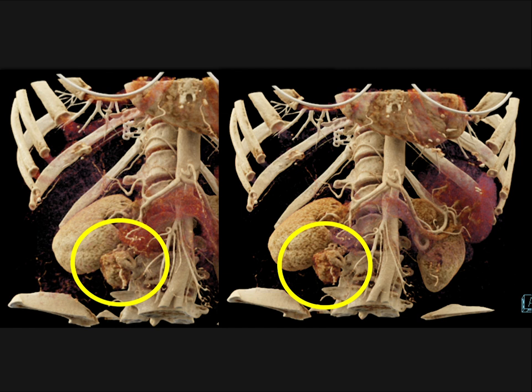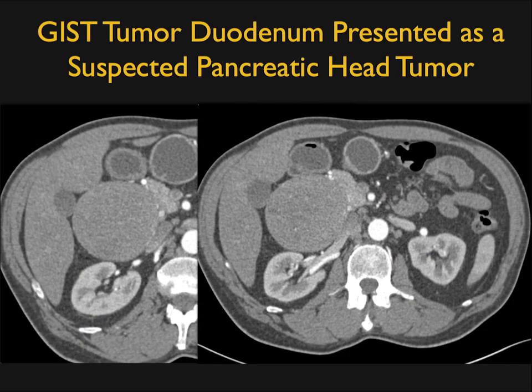Now, these cases all were for the most part vascular. There was some confusion, but here's a really tough case. This is a big mass here, which was sent in for pancreatic cancer, but you realize there's no common duct dilatation or pancreatic duct dilatation.